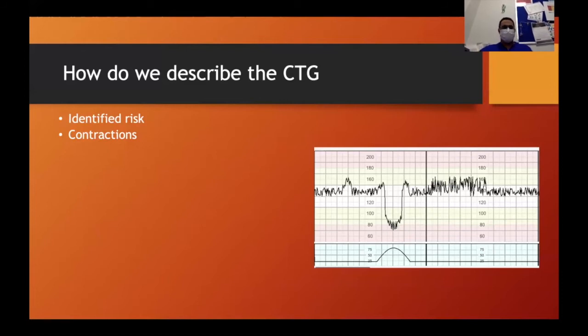So Robin was just saying that with the CTG there are no accelerations, decelerations. Yes, but why? What's the idea behind no accelerations, decelerations? Your baseline. You want to figure out what the baby's heart rate is supposed to be when it's resting, when there's nothing else happening. That's what baseline means. It's at the base when there's no other activity.